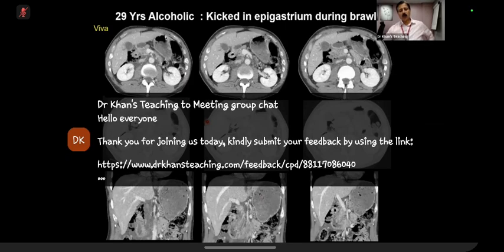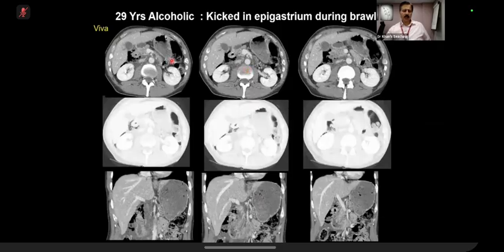Right, very good. On a CT, of course, you are handicapped here, but on a CT, you will pick it up. Please remember that the duodenum is a retroperitoneal structure, and part of the idea was to show you that part of the gas is going around the kidney also. And you can see that this is the wall, this is the wall. Actually, in this particular case, you can see the defect in the duodenum.